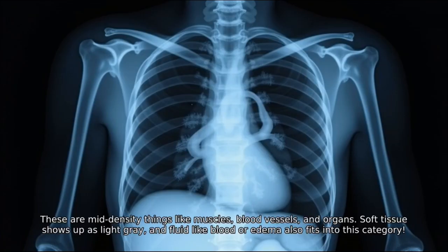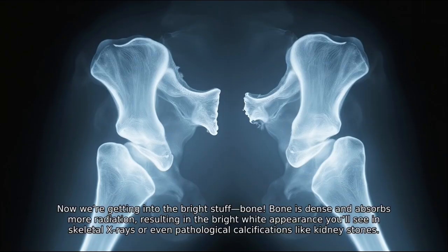These are mid-density things like muscles, blood vessels, and organs. Soft tissue shows up as light gray, and fluid like blood or edema also fits into this category. Now we're getting into the bright stuff.